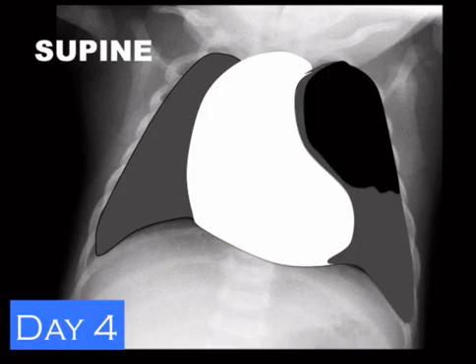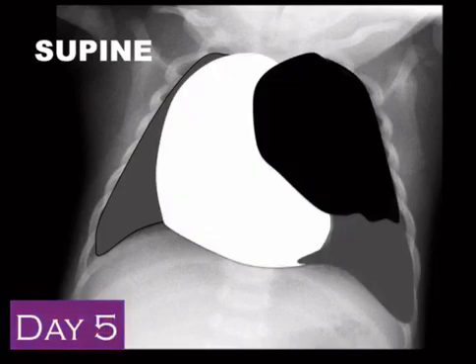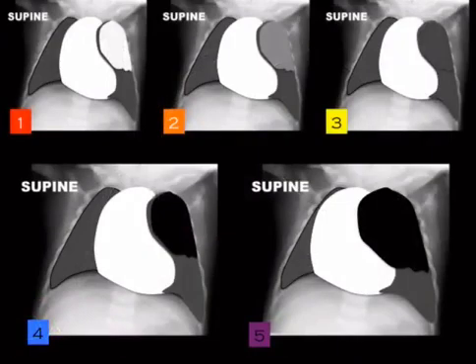And then that lucent area starts to expand. So something like this. What's actually happened is it starts out fluid filled, and then as that fluid clears, you start trapping air more and more and more progressively. So that's the classic congenital lobar emphysema.